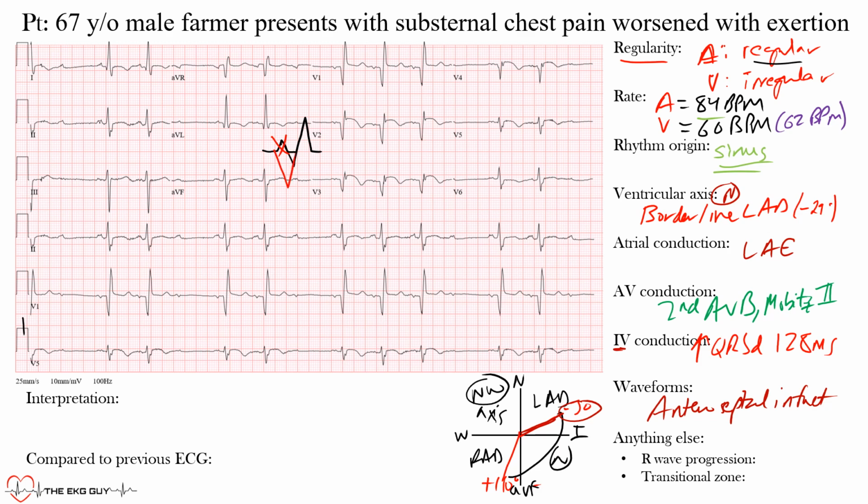So whether it's an old or a new infarct, you can see this. Notice you have a QR wave. This late R wave, that late vector that's coming towards the right ventricle, and here that slurred S wave that we see, the prolongation of the QRS complex. This is a complete right bundle branch block pattern. So complete right bundle branch block is present here as well.